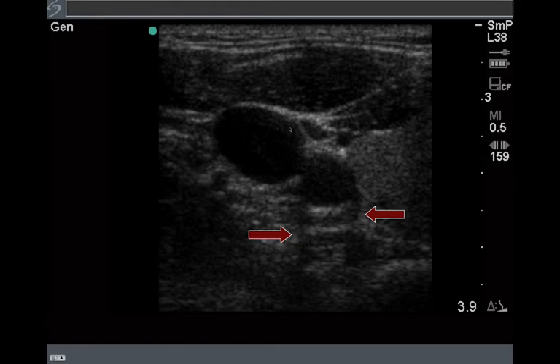This here is an image of the neck. This is the internal jugular, and this is the carotid artery. The ultrasound beam comes straight down here, hits the edge of the rounded structure and is refracted away. And so instead of being reflected back from behind here, no reflection happens from directly behind the edge of the rounded structure.